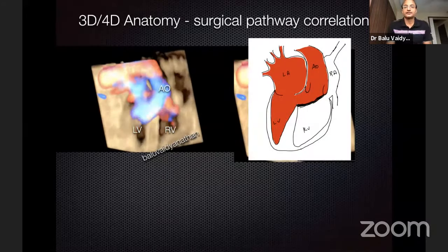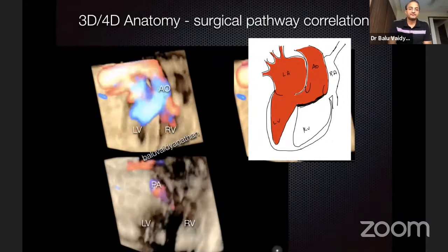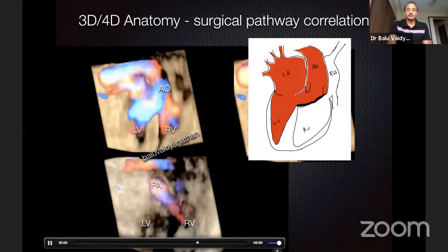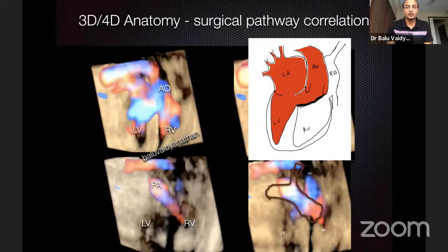And that's how it is. That's how the picture will come. The LV to the aorta is committed this way. And then you have the RVOT coming here. And simply you see at the bottom of the PA, there is a narrowing. So that's the pulmonary stenosis. And then they will put a patch to repair the RVOT. So a total correction is possible with good outcomes.